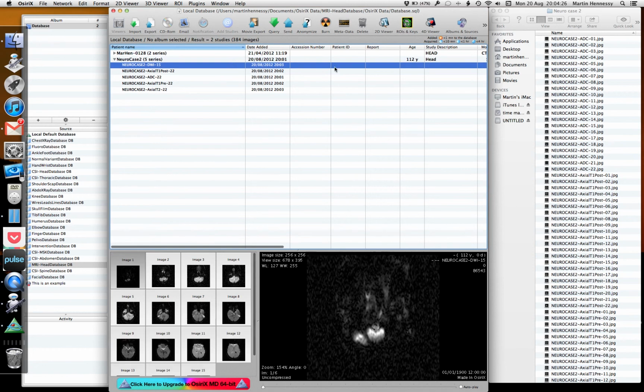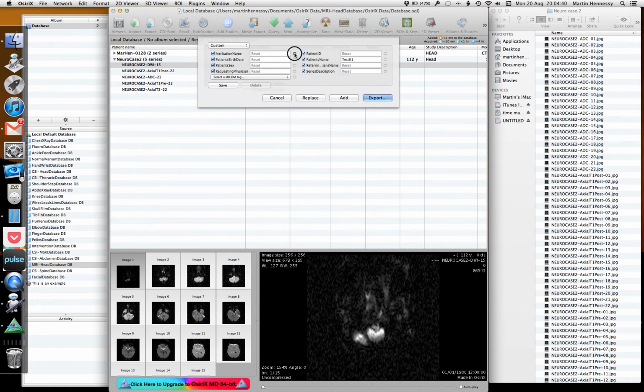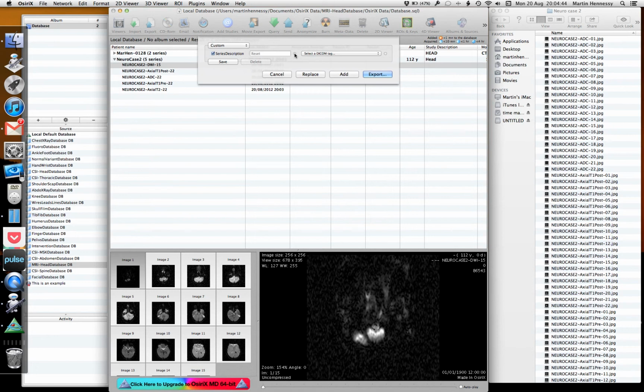So for example, just pick that one line, and take everything off apart from series description and call this DWI. Actually, I won't call it anything yet.